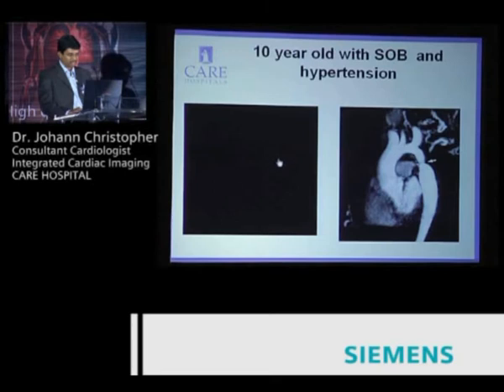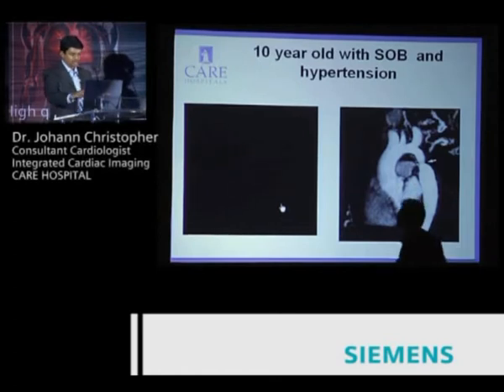And what we were talking about, which has recently been validated, is we put a VEC image here, see the flow just below the coarc segment, and we put another one just here. And we found that in patients with severe coarcs by echo, the flow here, distally, is much more, showing all these collaterals which you're seeing here.